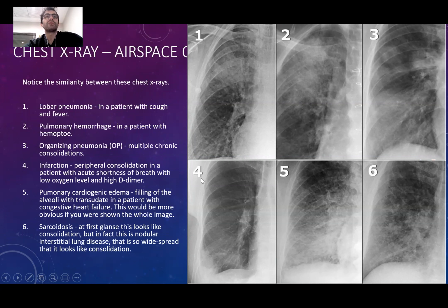In the case of the fourth, this is a pulmonary emboli case, because the circulation is disrupted here, it caused consolidation. The fifth case is a definite case for heart failure, because I'm seeing consolidations, right?